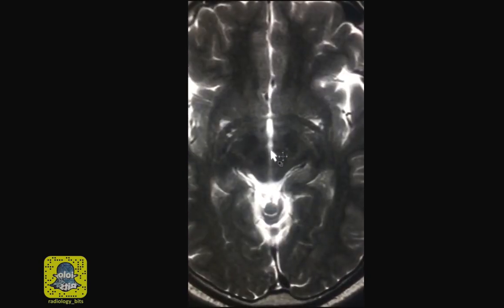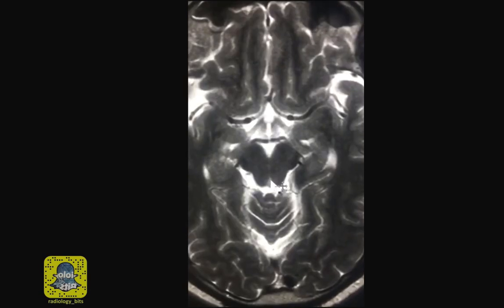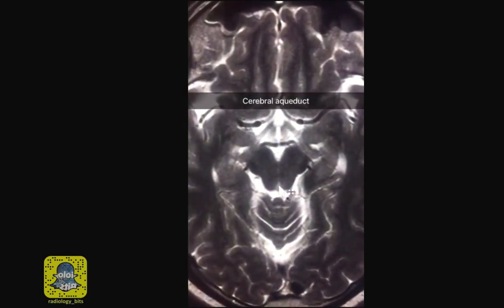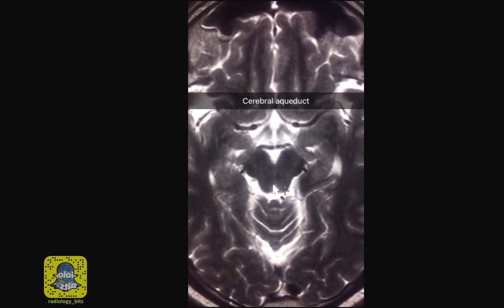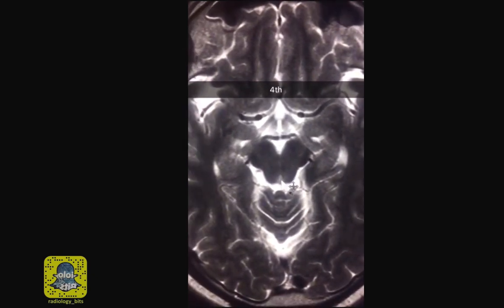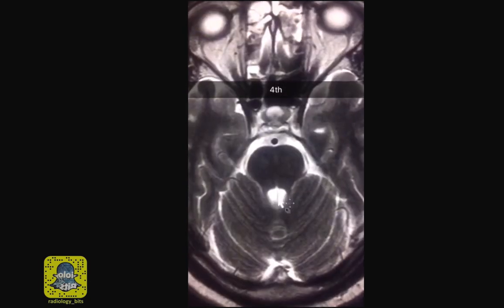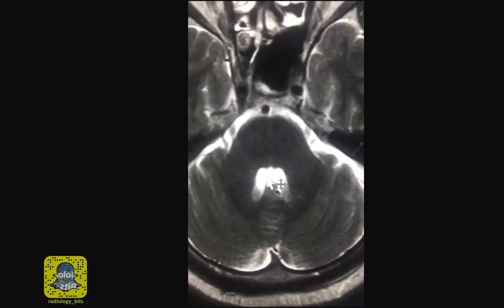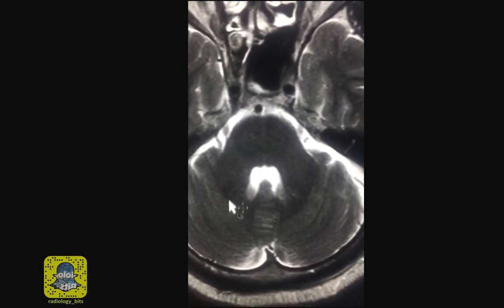And this third ventricular component continues with this rounded CSF dot here. It's a channel, which is known as the Cerebral Aqueduct of Sylvius. This opens finally into the fourth ventricle. Cerebral Aqueduct, which we'll nicely see on the sagittal images again, opens into this here, which is the fourth ventricle. Notice how the fourth ventricle is surrounded by the brainstem and cerebellar components.